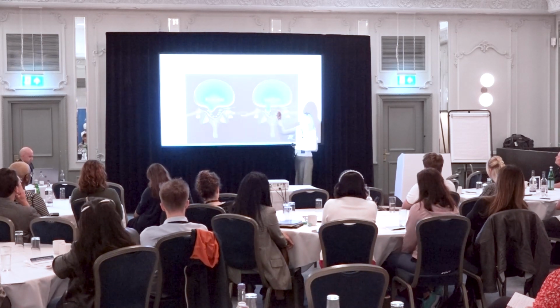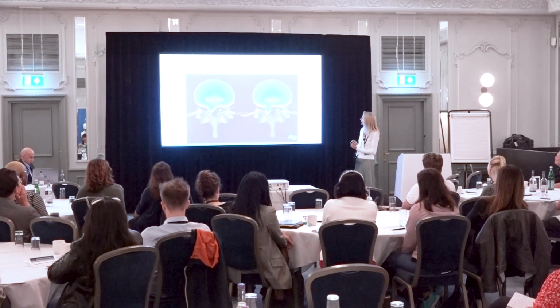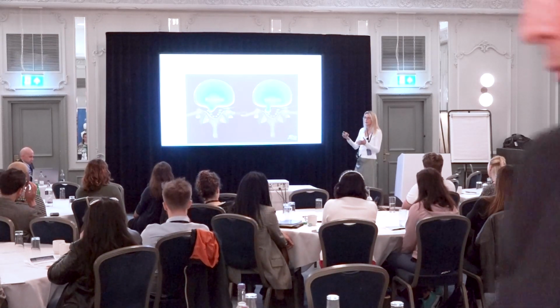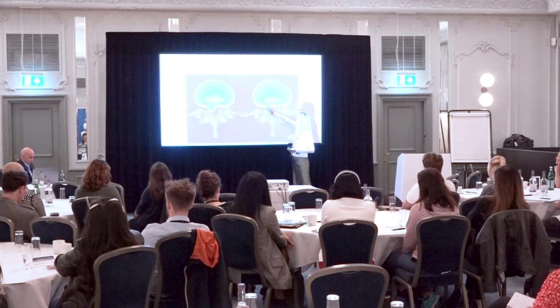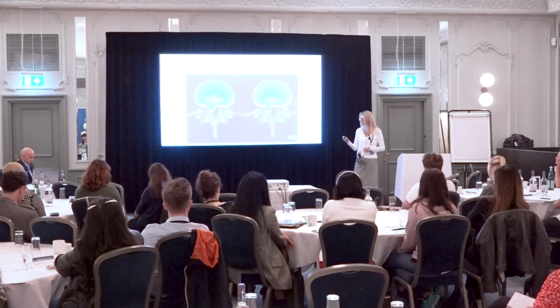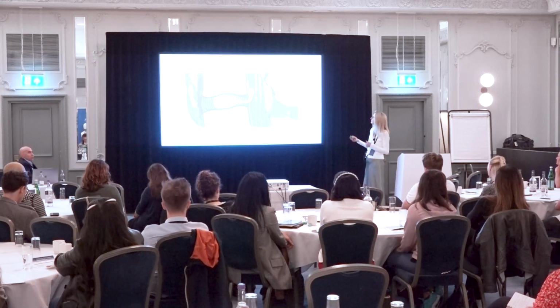When you talk about extrusion, it's not a condition that I consider to match these pictures. But an extrusion is when the disc herniates right out and goes into your canal and moves up or down. Usually it means that this dimension here is bigger than that dimension. In my experience, most extrusions are broad-based, and they are often migratory. It doesn't really make much difference whether you talk about an extrusion or a protrusion, it's just degree.